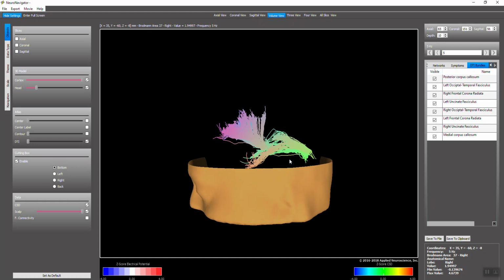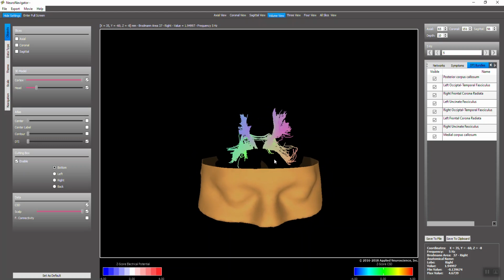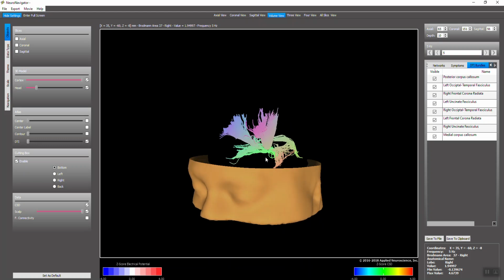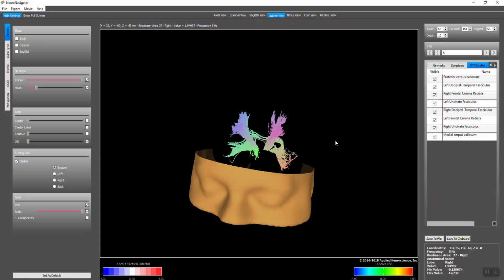Now, these diffusion tensor imaging bundles show the actual connectivity. We can superimpose the connectivity of the fiber bundles connecting different parts of the cortex, but they're spread out. For example, this is the corona radiata, but we can superimpose, if we wish, the Brodmann areas and the functional connectivity. And in the future, we're going to have functional connectivity of the diffusion tensor imaging itself. We'll be able to look at coherence, the colors will change, we'll be able to look at phase differences depending upon the deviation in degrees or z-scores. The colors will change of these various bundles.